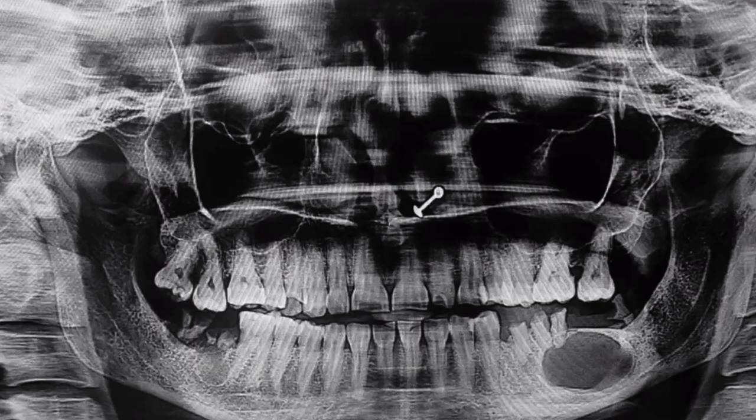I think to confirm my findings, I think it's a periapical cyst. So I would like to know the history of the patient. Yeah, that is very good. History is provided. Has any dental extraction been performed previously or not? No tooth extraction. Would you like to have any cross-sectional imaging like CT or MRI? Yes, I would like to see the CT of the patient. Okay.